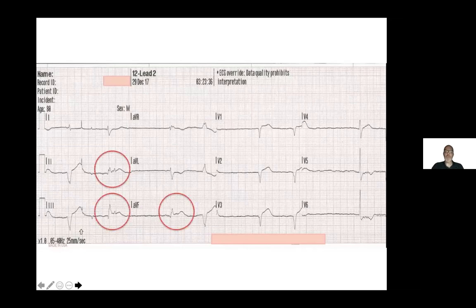And this patient's complaint was nausea, vomiting, and diarrhea in the middle of flu season. So obviously, a presumptive diagnosis is you've got the flu. But that's not what this guy was having at all. He had no chest pain, but you see he's very bradycardic. And if you look around this EKG, you don't see any P waves anywhere.